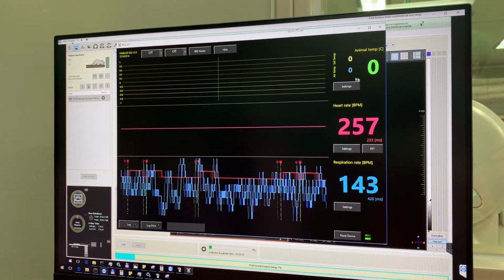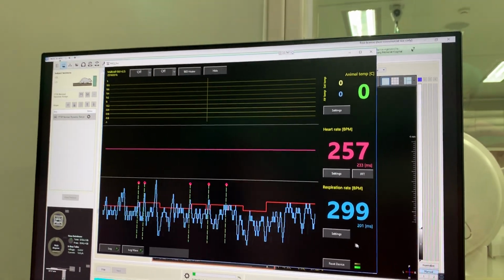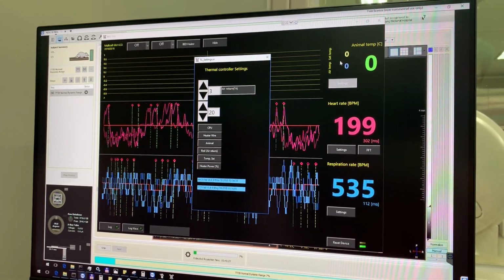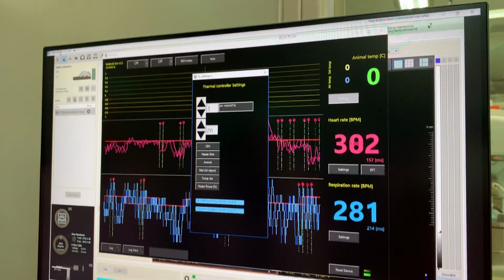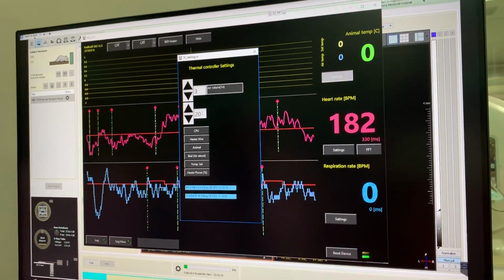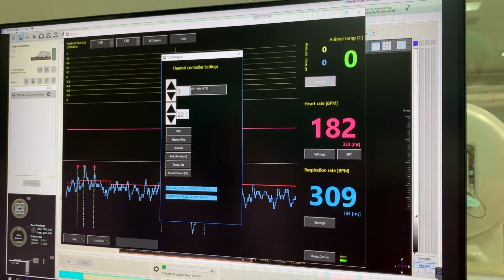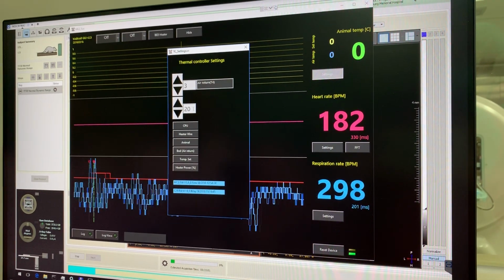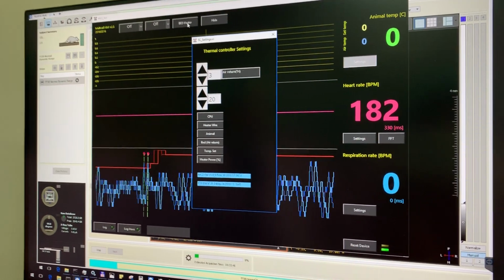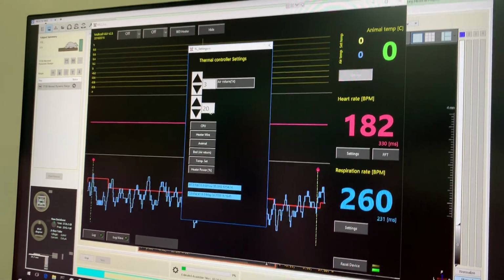So the way you can set up, maybe we should reset this device because there is nothing here. Under the settings, you see this is the set temperature. By default it is always 20. So even though you just turn on the bed heater by pressing this button, it will not really heat up the bed because the set temperature is only 20 degrees.